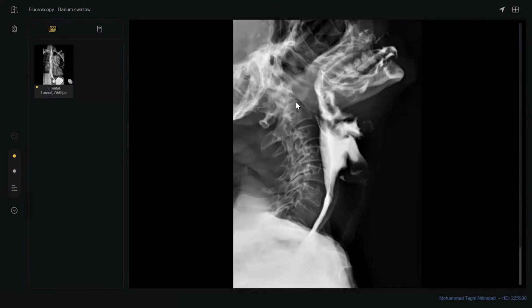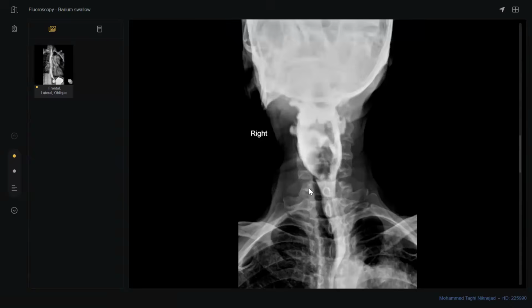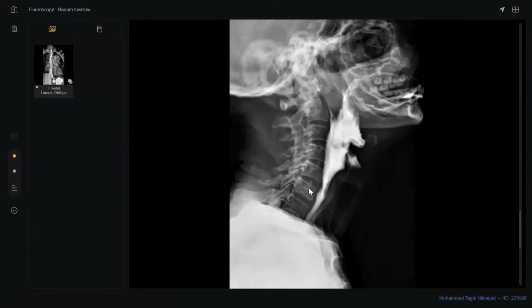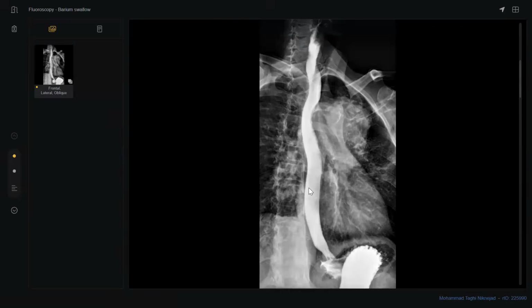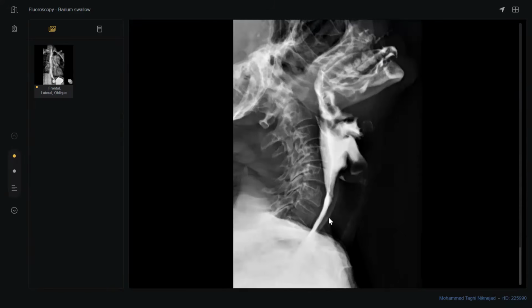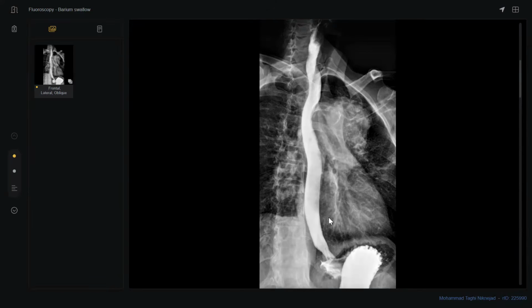What happened here? A very misleading complaint. Most of us will concentrate on the barium. As I advised the previous candidate, don't tell any diagnosis before either you are very sure or you exclude others. Here, if you look, the barium column runs from the top down very smoothly, superior and in the lateral flow. So search for another tricky point or another diagnosis.